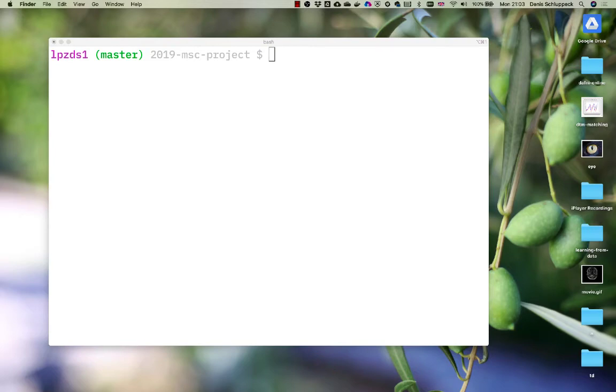Hey everybody, just a couple of short videos to show you some stuff that I didn't get a chance to say at the end of our last conversation. So this is about maximum intensity projections and sort of a starting point for looking at the data set that we already have on disk.